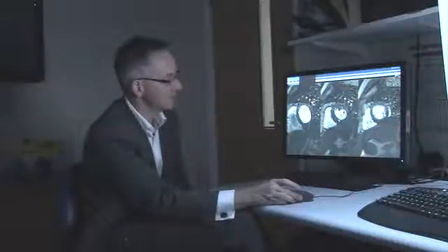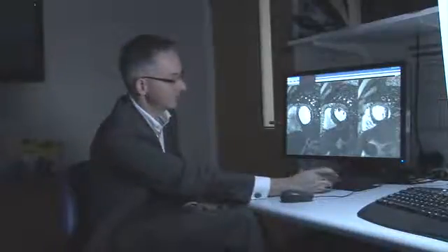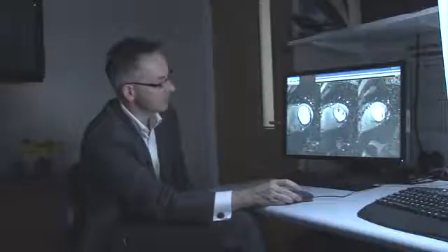This is a typical position where it occurs, and we can see it, so it's there before the contrast has arrived. Now as we go through, moving on each heartbeat as I click the cursor, we can see that that dark rim artifact is still there, but as we go into the true stress part of the study, the contrast has arrived fully into the myocardium, and the signal intensity has increased quite dramatically. It's gone from a dark shade of grey to a light shade of grey, and here in the inferior wall it's stayed very dark, very hypo-intense. And here it's now occupying almost the entire transmural extent of the myocardium. So this is very uncharacteristic for an artifact. This is quite clearly a perfusion defect.